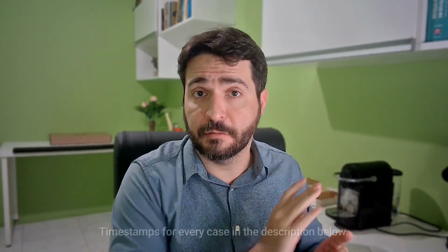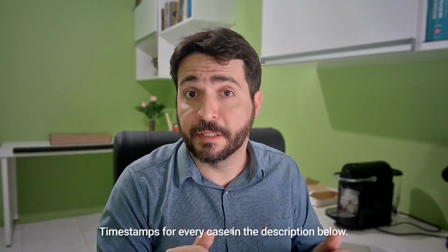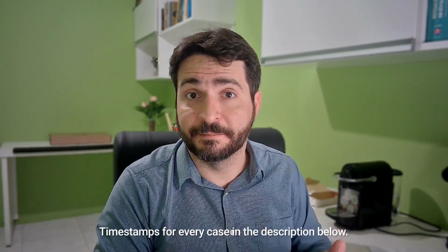Hello there! So, MRI is fun, my queue is full of new exams. Why don't we go through a few cases from the clinical history all the way to the report? I'm going to share my screen and we're going to have some fun. Let's get started.